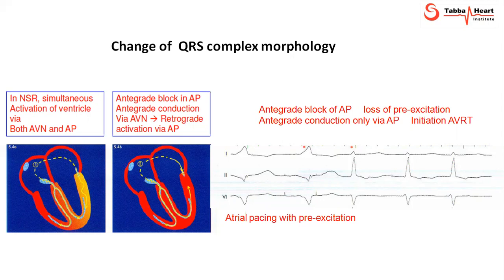This may not happen all the time. You may not see a loss of QRS morphology pattern change. You may just see a PAC starting a tachycardia without a change in PR interval, right? So if you see it, it helps. You may not see it all the time. So do not overthink that this must be happening. What you see, just describe that and think of that. Narrow complex regular short RP tachycardia. That's it, right?